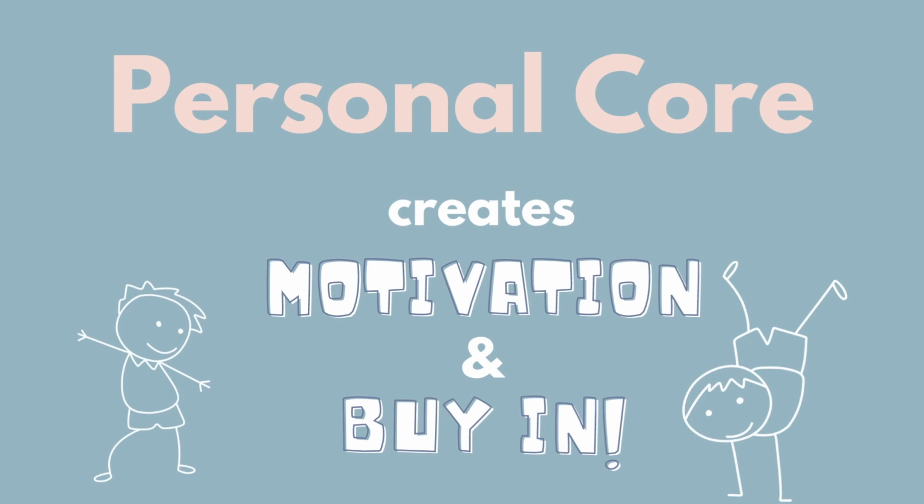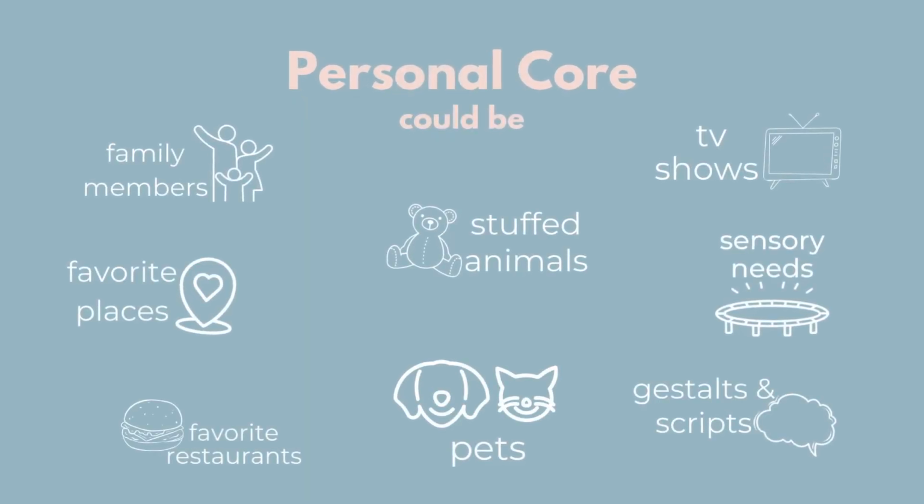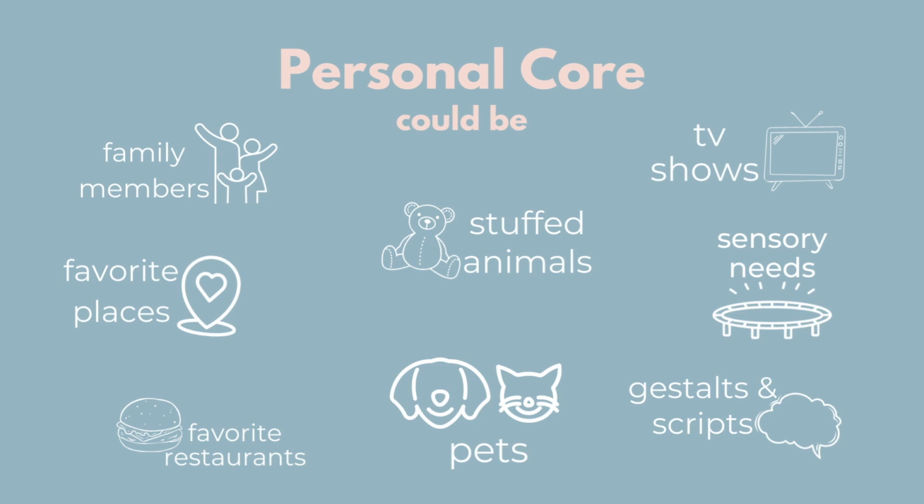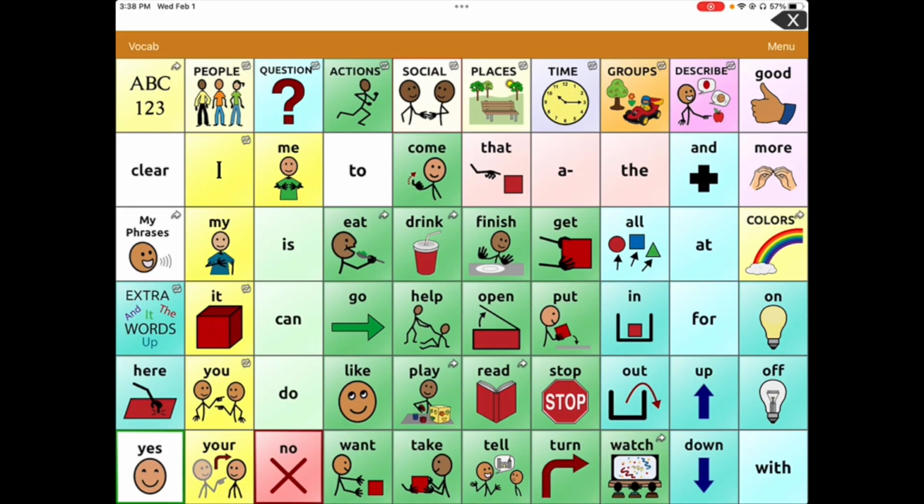So personal core can include things like family members and favorite people, favorite restaurants or places, names of pets or stuffed animals, or common phrases that your family uses. We want the device to be the child's voice, and every voice is different, so we want the device to reflect that. So I'm going to show you how to edit a button in the device so that you can add those personal core words.